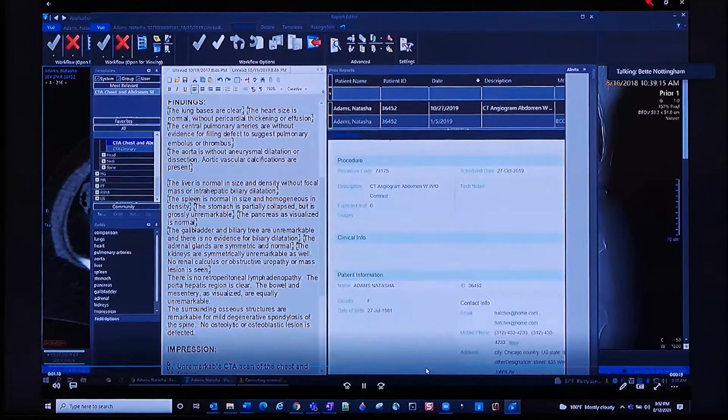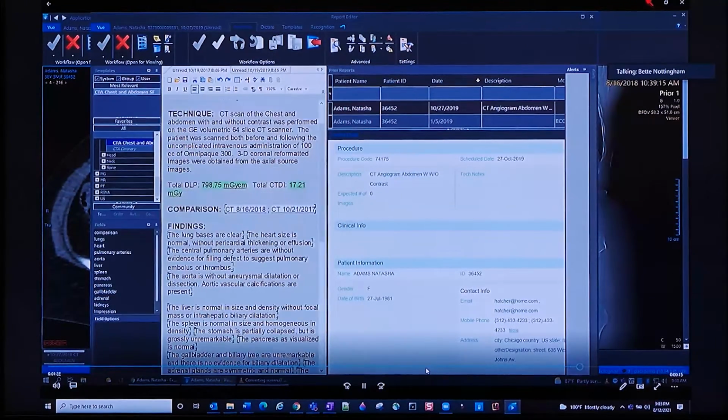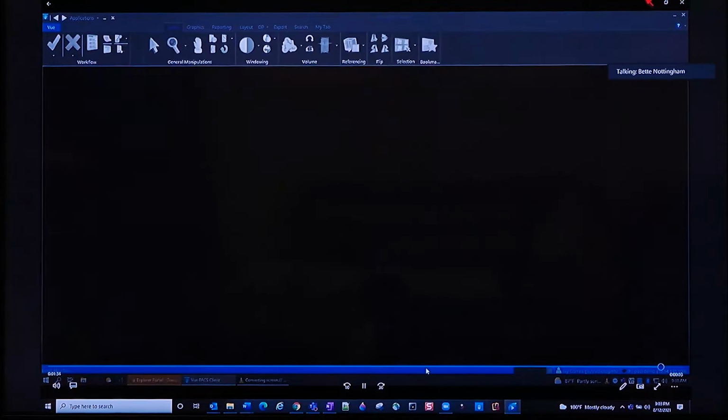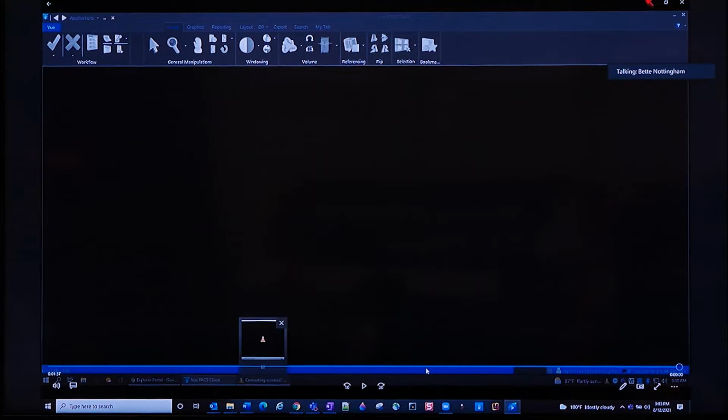The radiologist dictates the report while pulling priors and medications from different institutions. View multimedia reporting enables this to be made easily. Hyperlinks with all the priors available will be inserted in the report. The patient can access the report and images, including the priors, while reviewing and assessing Natasha's medical condition.